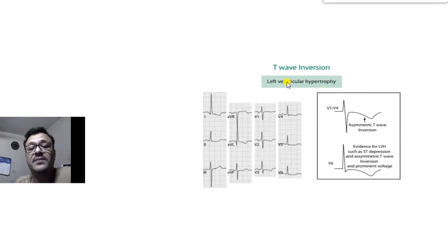Now the left ventricular hypertrophy strain pattern. We already know the causes of asymmetrical T wave inversion: ventricular hypertrophy strain pattern, hypertrophic cardiomyopathy, digitalis toxicity. In the strain pattern, the asymmetrical T wave has a downslope and an upslope. These are not the same or identical.